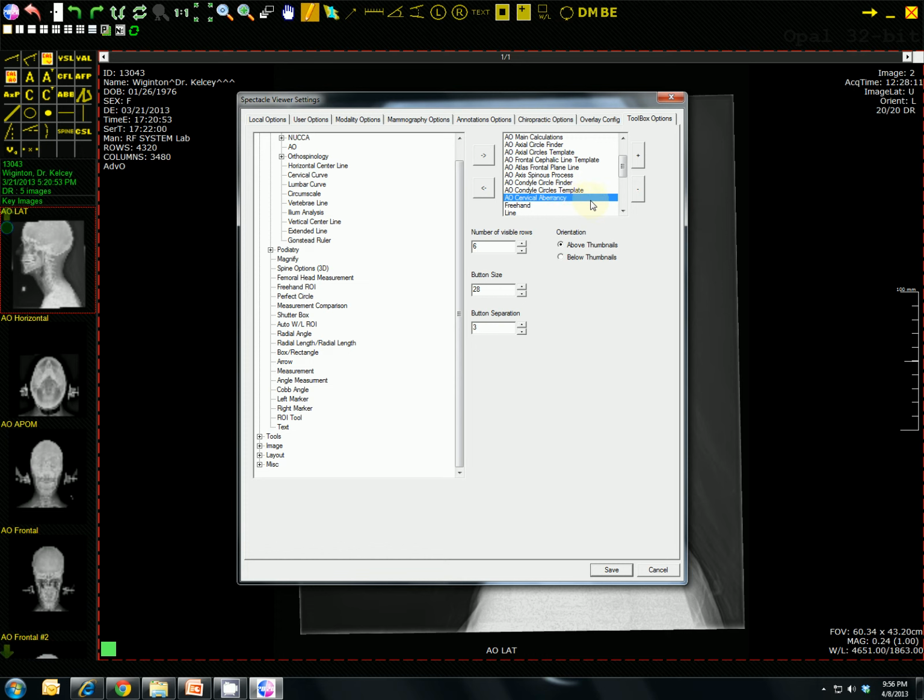avariancy. Okay. From here you have your drawing tools: you have your freehand, your line, your ellipse, and your mark spots. Also to help out is the horizontal axis and vertical axis, just a nice thing to have in there. The other one is the vertical level and horizontal level. And that's where you have, well, I'll show you in a little bit what those are. George's lines, obviously that's very important to put in.